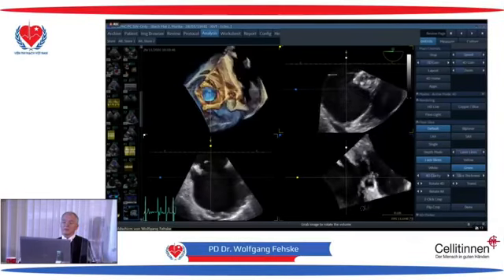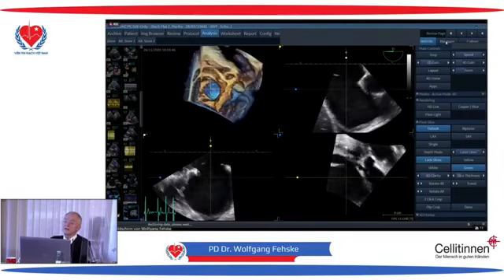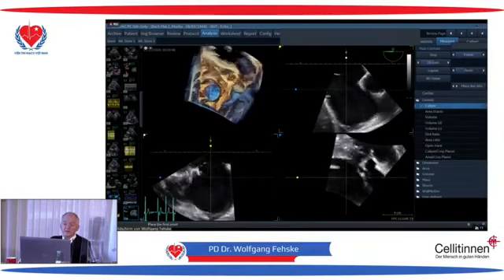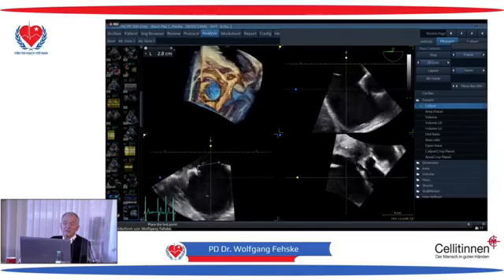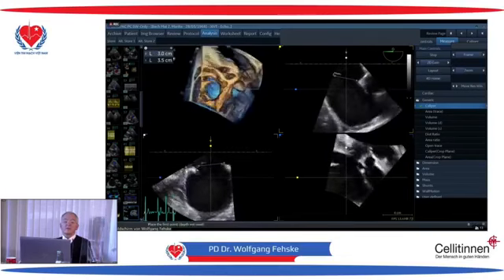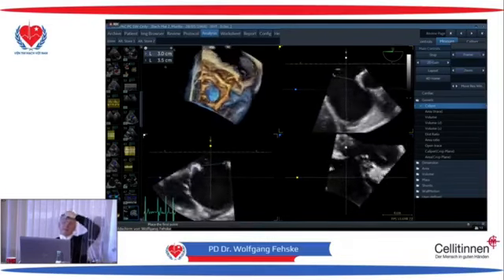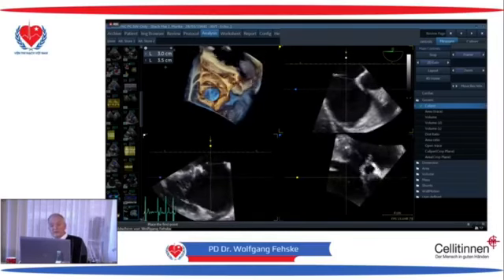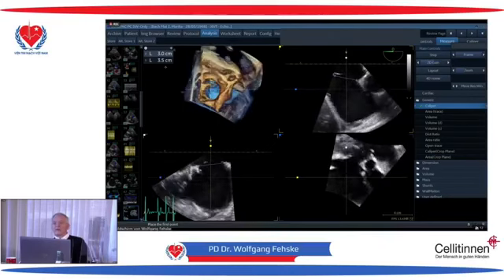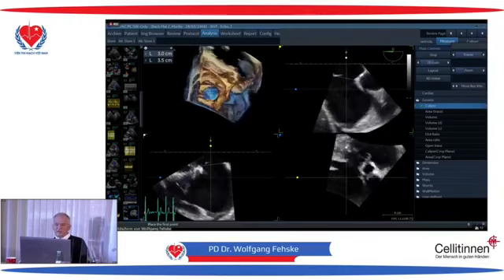So we should really operate on that patient. This is why I proposed, it came from outside. I proposed to operate on the patient, and my surgeon is, you see, this is one dimension, this is the other dimension, it is 3.0 over 3.5, and the new guidelines of the European Society of Cardiology, the international guidelines, say that all which is below 4 centimeters should be tried to close interventionally.